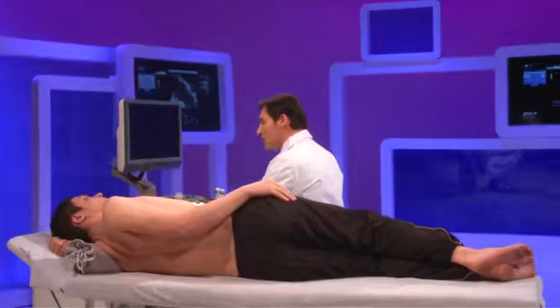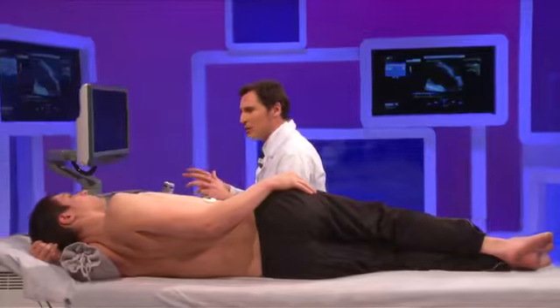When you want to assess a patient with degenerative mitral regurg, so primary mitral regurg, so intrinsic mitral leaflet disease, you need first to evaluate the morphology of the valve, which belongs to the qualitative assessment. You need to assess the semi-quantitative parameters, and in these parameters you have some of the parameters related to the severity of the mitral regurg.